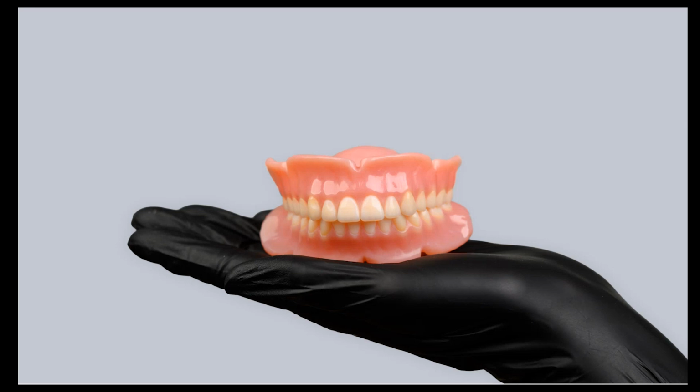Lior, we have a question. Can you explain what happens when you're bringing in a 3MF file, please? So if you have a 3MF file that contains, as I said, a different 3MF file for each one of the teeth, everything works as usual.